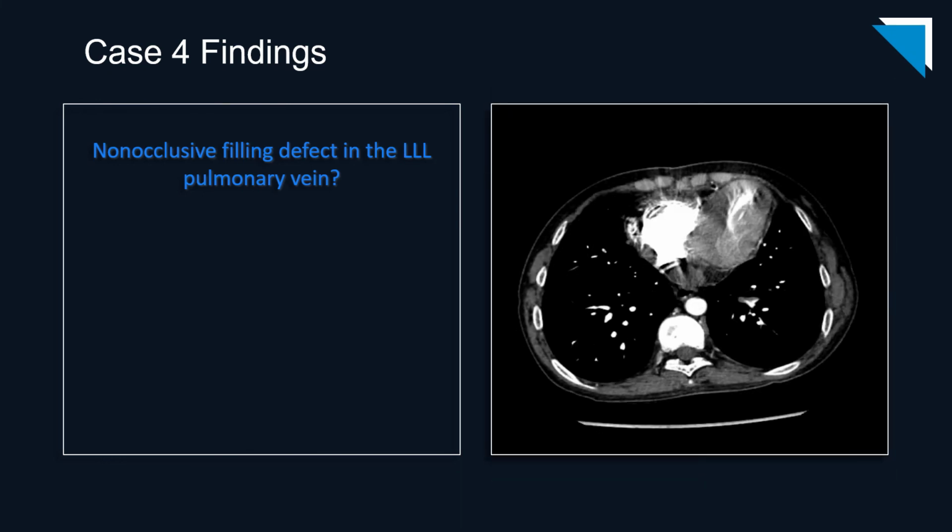I think this finding is real and has improved on the current study, but whether you believe it or not, it was discussed by the prior radiologist, and you are therefore bound to discuss it on the current study, even if it is just to dismiss the finding as artifactual. Personally, I'm comfortable removing the question mark here. Certainly on the prior study, I think this is a real thrombus.